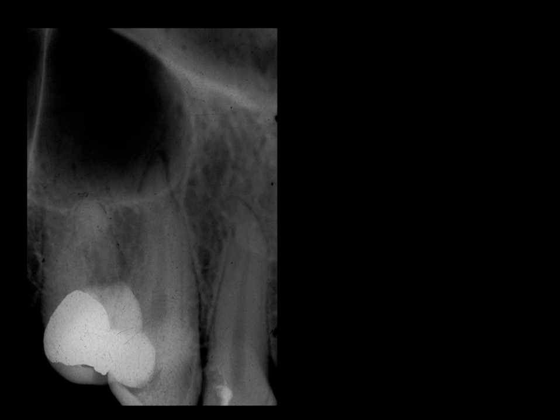Here we're on the contralateral side, on the upper right, and here we see the typical Y line of Ennis again. However, someone asked me about this radiograph and suggested that maybe this would be the Y line off the edge of the radiograph, and that this area of radiolucency might actually be a cyst arising from one of the two teeth.